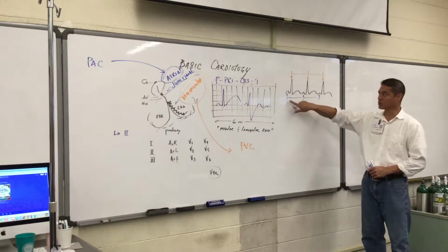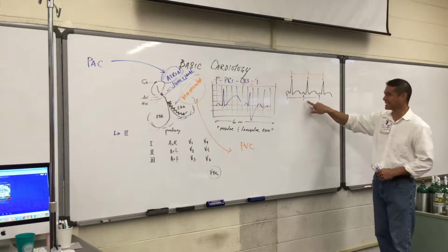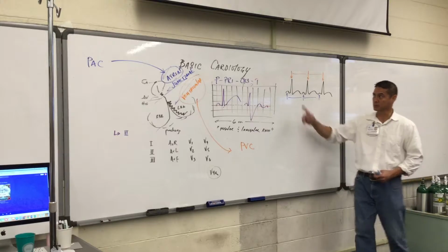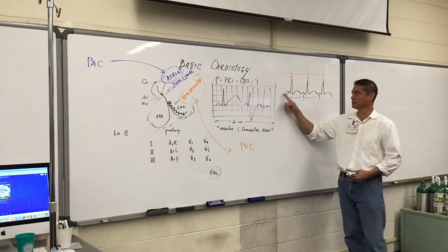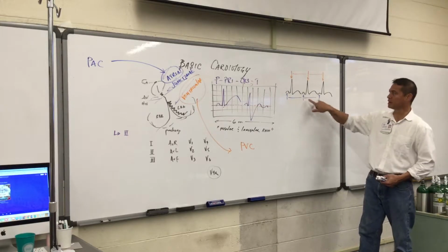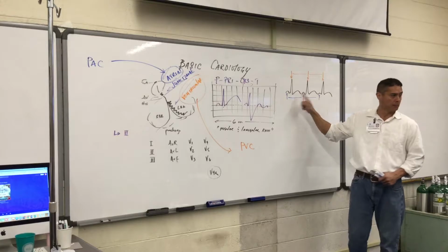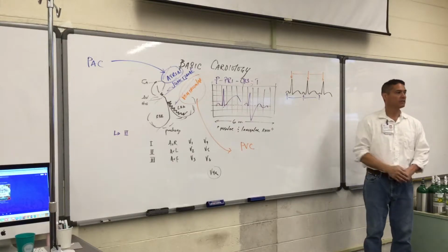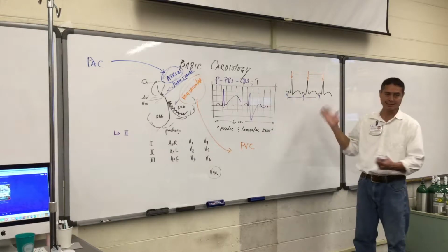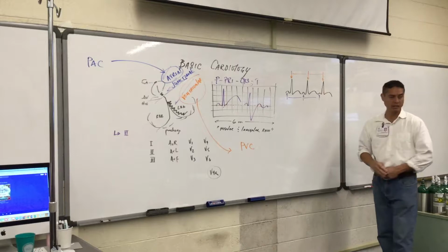Again, we're going to measure out these P waves to make sure that the P to P is exactly the same from one complex to the other. The entire complex, remember, is a P, QRS, and T. This entire thing is one. So you need to measure from here to here. Now, if you start wandering around and you start thinking that this might be a P wave, go ahead, try to measure it out, see if it comes out. More than likely it won't, just because that's just how it is. This is one complex, this is the next complex, this is the next one here.